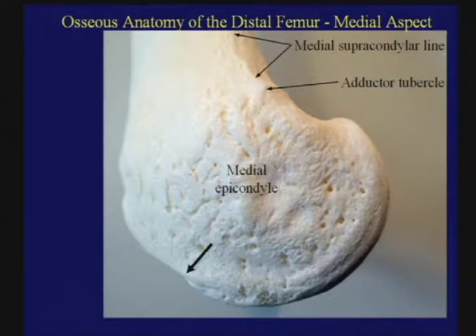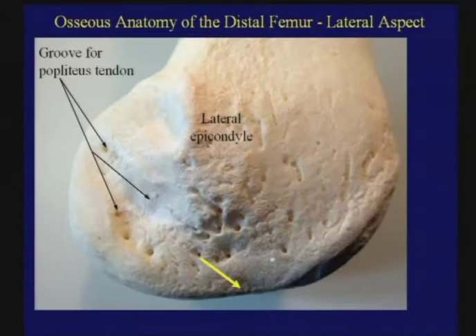And what it is telling you is the point of separation of the patellar or trochlear surface of the medial condyle and the true weight-bearing surface of the medial condyle. Normally we never do weight-bearing anterior to this particular point. It is true that the patella may ride down below this point, but we never weight bear more anteriorly than this point. On the medial side, if you see this, it will be very far anterior as shown here. But when you compare that then to the lateral side, you can see a major difference.